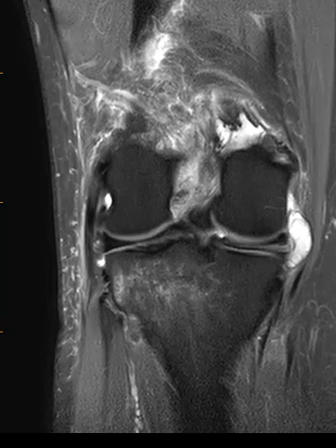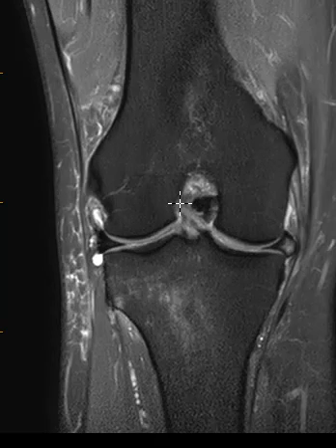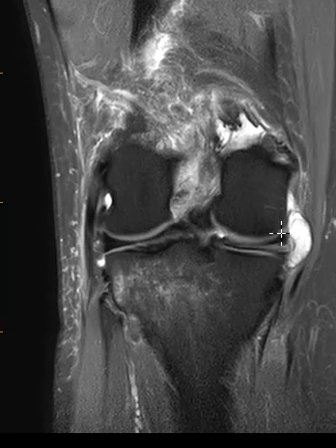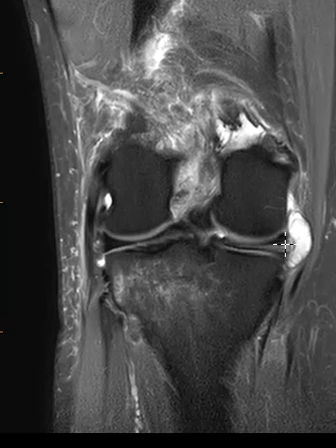She injured her knee skiing recently, and she tore her ACL, unfortunately. Her ACL is a ligament right here in the central part of the knee, but the reason I'm showing this case is because of another pathology, off on the medial side of the knee. There's a complex fluid collection.